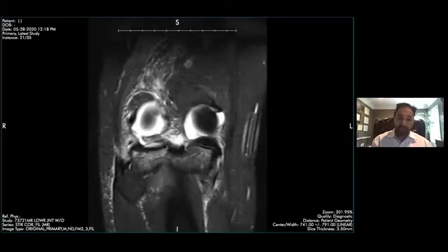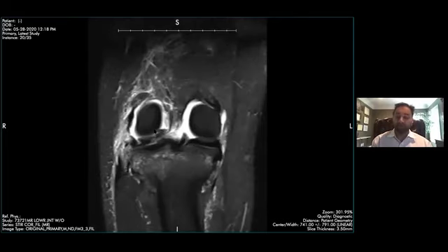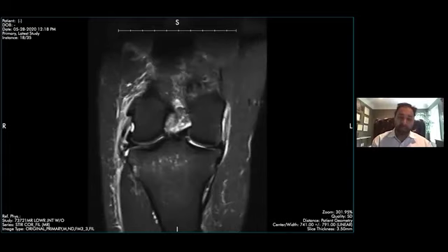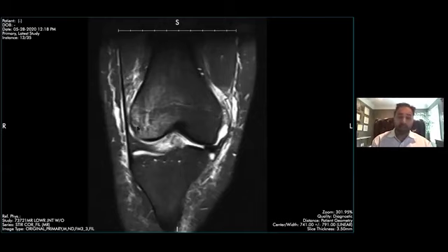And then if we go posteriorly, it doesn't look that great, right? This may involve a root. This may be a root ligament tear as well along the posterior root of that ligament, okay? And you can see part of the tear, it's sort of a complex tear. There's some signal here, there's some signal there, so this lateral meniscus is not looking great, okay?